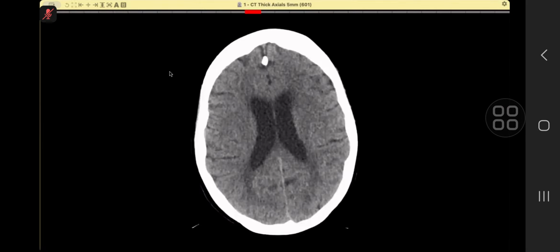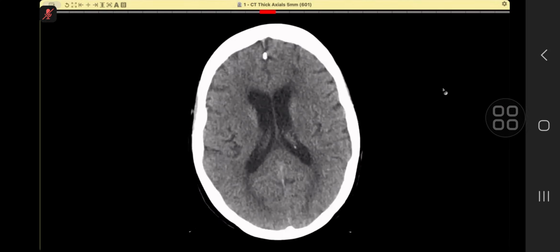Next is... who's the next candidate? Are you with us? Good evening, sir. Good evening. So this patient has got a history of breast CA. The patient is a 76-year-old with bilateral diplopia, and she has a history of iodine allergy. So initially a CT was done without contrast. Anything which you can pick up on this case? Okay.